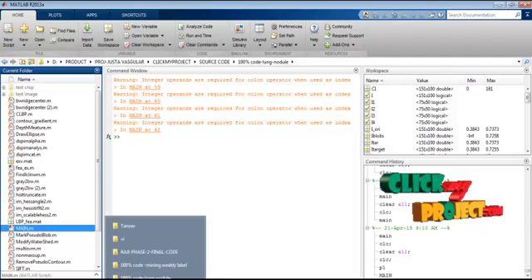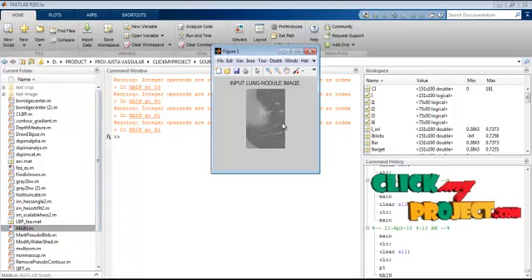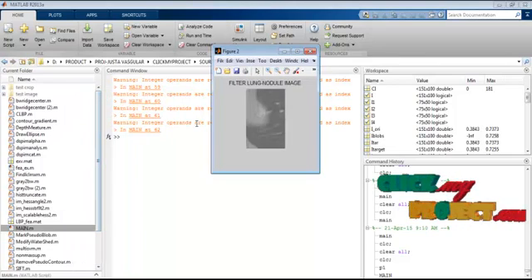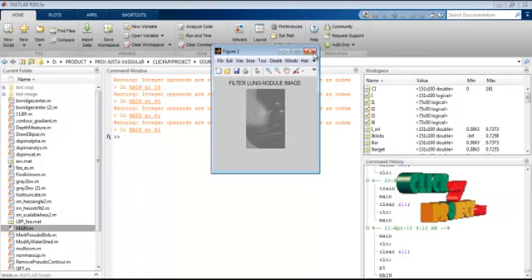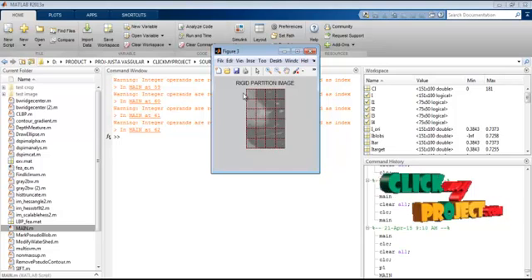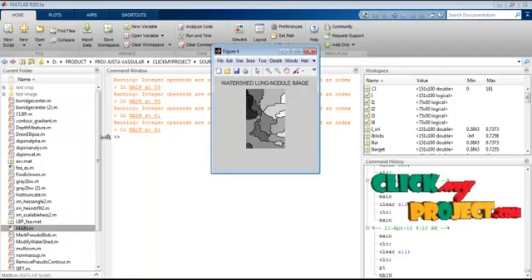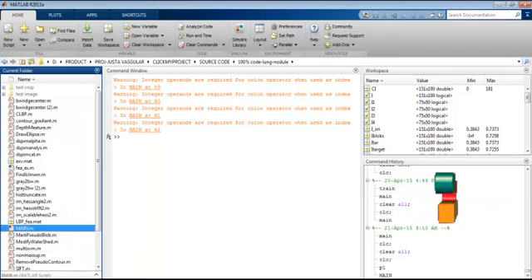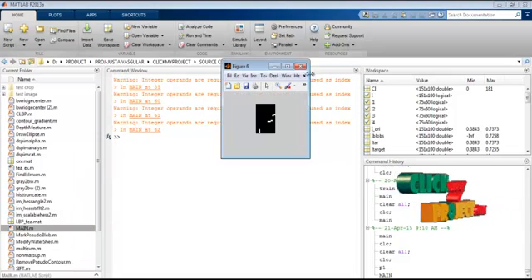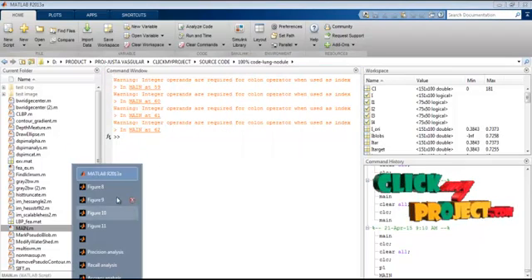Then we calculate the results. The first image is the input lung nodule image, the second figure is the filtered input lung nodule image where the orthogonal filter is used, and the third image is the partition for the rigid partition. Then the fourth image is the watershed lung nodule image for the given input query image, and the fifth separates the binary form of the overall image into 4 separate parts.